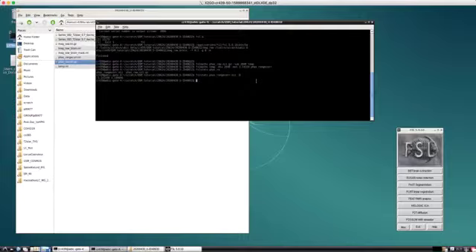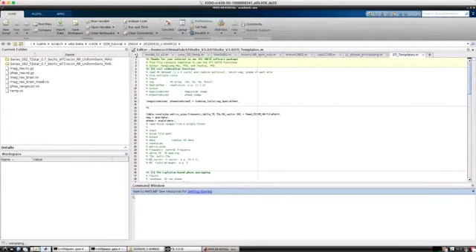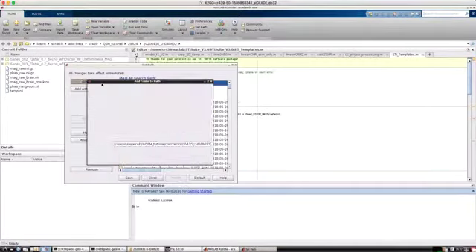Now we can load STISuite. You can download the STISuite package from the STI website, and this is a package that's compatible with MATLAB. So what I usually do is I load MATLAB on HPHI, and because this is HPHI, it will not save any of your directories, so you have to load into the actual path for STISuite, which you will do in a second once this is open. So you have to set a path for STISuite.